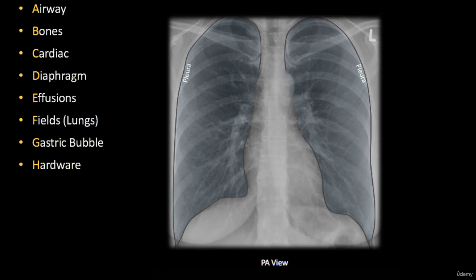The fields of the lungs should not be absolutely transparent. We have some soft tissues, we have vessels, bronchial trees, which you see here on the right and on the left, running up and down from the roots of the lungs. Some shadows are the bronchial tree, and smooth lines all the way around belong to the vessels. Hypertransparency of the lung field is a sign of lung emphysema. It's not very good. That means we have too much air inside, which cannot find the way out.